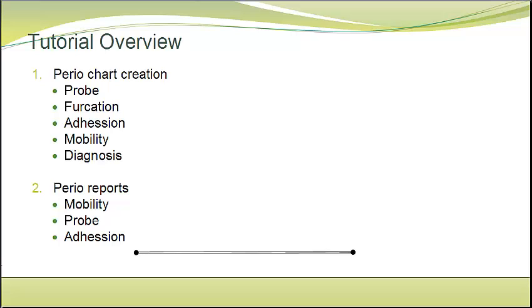In this tutorial, we will demonstrate two things: the Perio chart creation and the Perio reports. In the creation of Perio charts, we will see how we can enter values for probe, furcation, adhesion, mobility, and diagnosis. And we will view the reports that relate to mobility, probe, and adhesion.